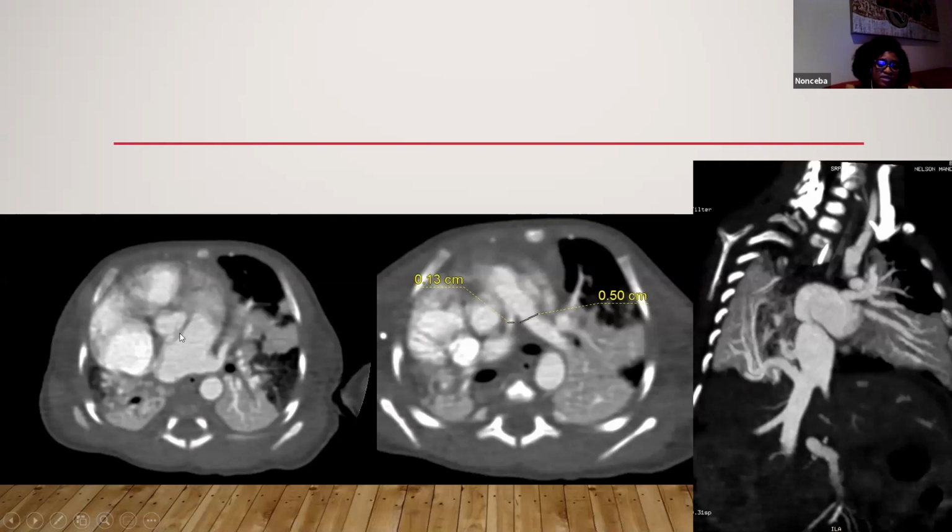As you can see here, this is your left atrium, and on the left you do have your pulmonary veins draining in there, whereas on the opposite side, you're not having a pulmonary vein. Hence, you're having the anomalous drainage from that side. Then, like I said, they tend to have hypoplastic pulmonary arteries as well.